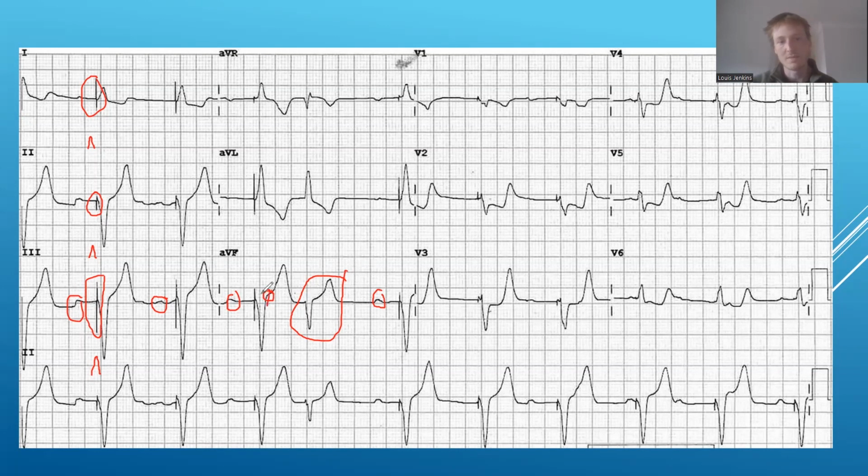I'm not sure if that's a P wave actually, disregard. The underlying rhythm here might be like a complete heart block, and that might be why this patient has a pacemaker, but I'm just speculating here. But anyway, it's not what we're looking at. What we're looking at is that concept of concordance and discordance, okay?